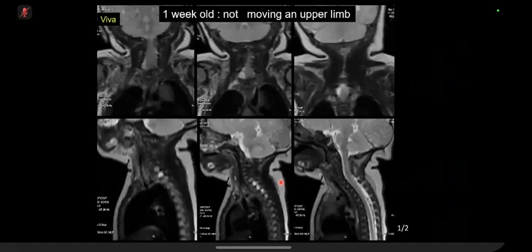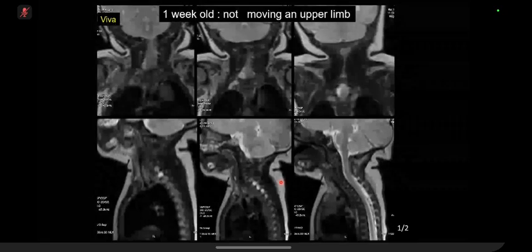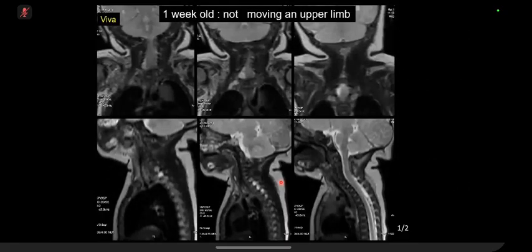Just having a quick look at it. So there's high signal laterally, especially on the right side in the top middle image, adjacent to the cord, and there's high signal going into the foramina, looking at the parasagittal images. I think this could be lateral meningoceles or pseudomeningoceles actually.